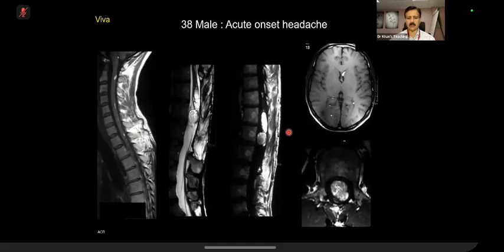And this was another ruptured dermoid. I have not shown you a case of ruptured dermoid, or a dermoid or epidermoid with a dermal sinus. Remember, that can also happen, that this thing might be connected to the skin through a dermal sinus. And please remember that at times you can get abscesses and things like that secondary to that.